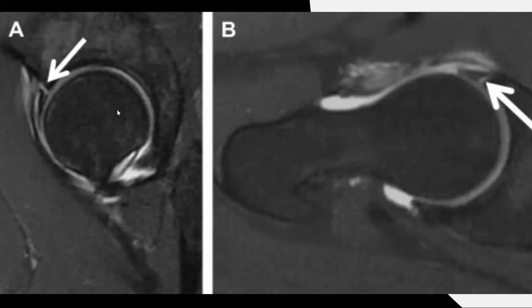We can see that the gadolinium, the intra-articular dye, is traversing across the labral base just over here. Can you see how it seeps across this labral base here, this oblique bright signal? And it also goes around this acetabular rim, so it just leaks forward here as well. You can see it here, it goes all the way across, and there's no continuity of this dark periosteal layer anteriorly, so this is a full thickness labral tear.